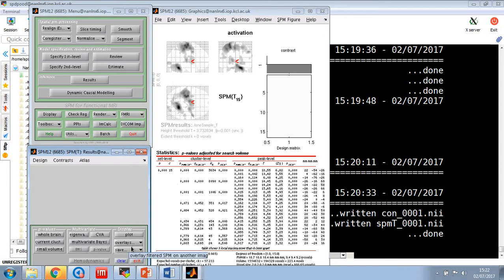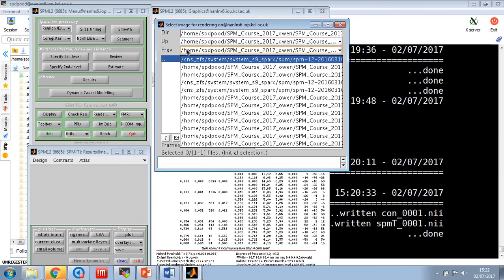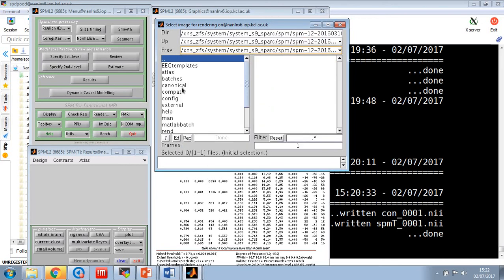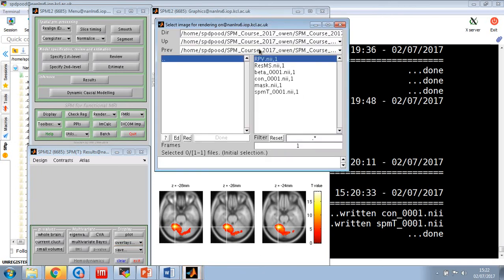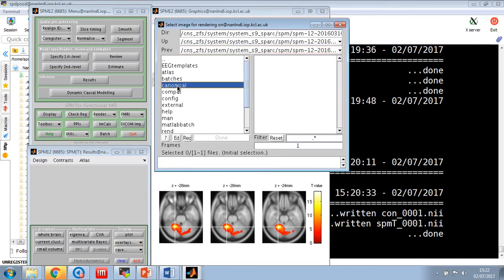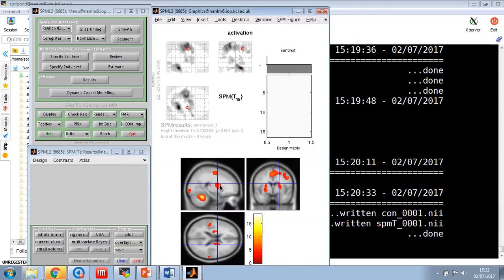Okay, so here's our map. Let's overlay it on a brain again. So you can move to where you want to, here, let's say, and then click on overlay, slices. And then it'll ask you what you want to overlay it onto. So we go to previous, go to the top, SPM, canonical. But let's click on sections. Now, because we've done sections before, I'll do it one more time. Go to previous, SPM, canonical, like that. We can now click around here.